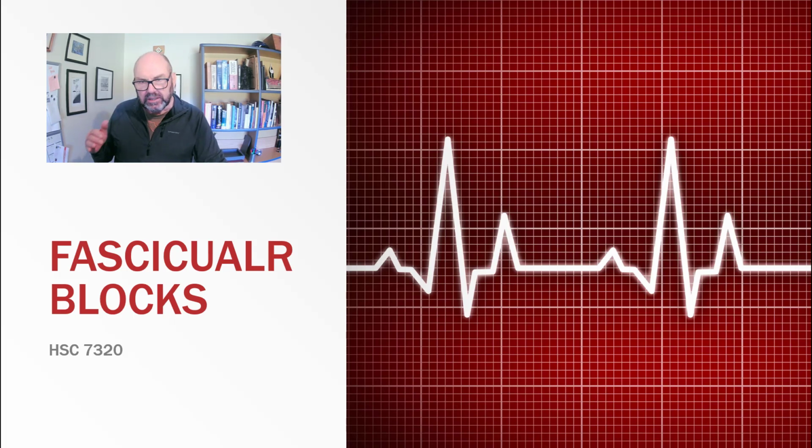Kia ora. This is just going to be a whirlwind tour through what is known as a hemiblock or a fascicular block that might show up on an ECG.